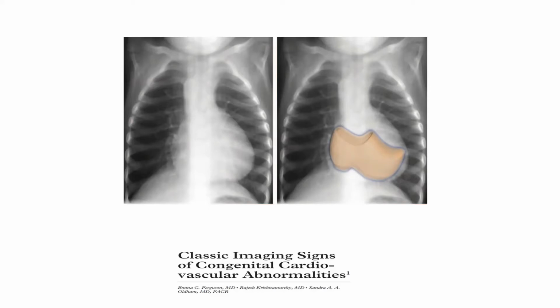When you have RV dilatation, the heart tends to migrate a little bit superiorly. It's as if its attachment to the diaphragm is reduced a bit, so it's floating on the diaphragm instead of lying over the diaphragm. So the RV dilatation usually leads to elevation of the heart.